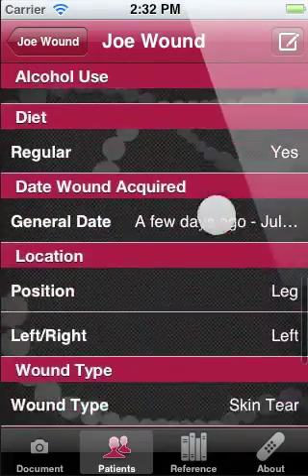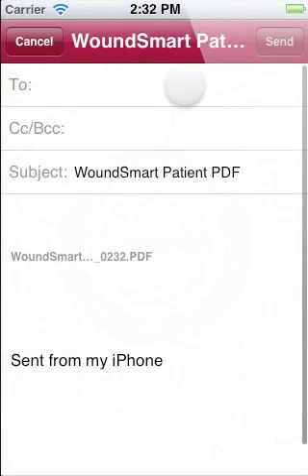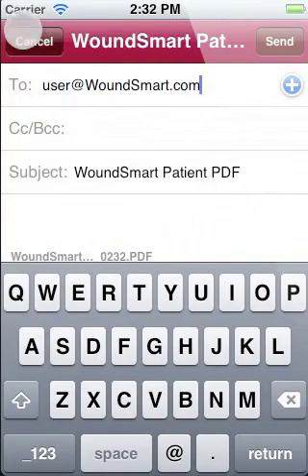Here we can scroll through the entry created and view the data in a clean, simple table. We can also create a PDF entry and use this as a PDF page we can print out with more information on the wound we observed.